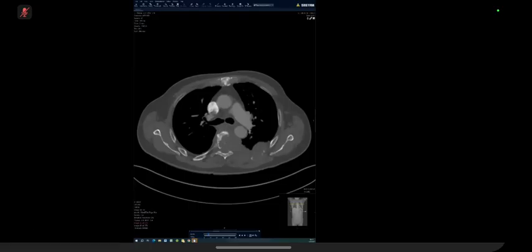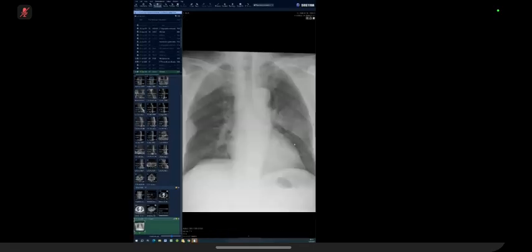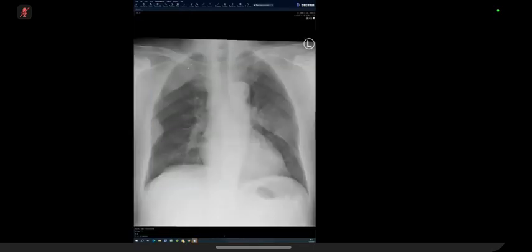Okay, well done. Let's move on to the second one. I think you got everything right. The description I wanted straight away was multiple bony lesions, because I think in this one it's quite obvious the bone is missing here, and that's why they look so clean. That's why you pick them straight away, because there's no bone behind it. If this was the only abnormality, I would buy the pleural based obtuse margin, etc. But here the bone destruction is quite clear. So I was looking for bilateral aggressive lesions causing bone destruction. I'm concerned for underlying malignancy, metastatic or primary bone.